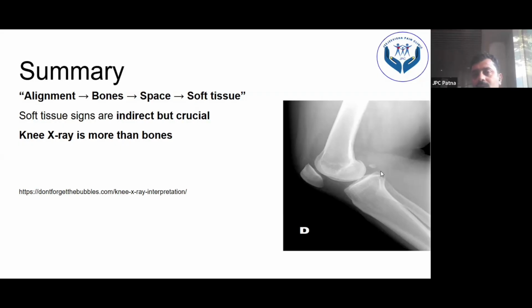So this is an osteophyte? Okay, many of us are confused. This is not at all an osteophyte. This is just the fabella, which is a sesamoid bone. Nothing much. It is a normal phenomenon, found in many, not found in many. So many times people get confused: this is an osteophyte, this may be positive. No, no, no, not at all.